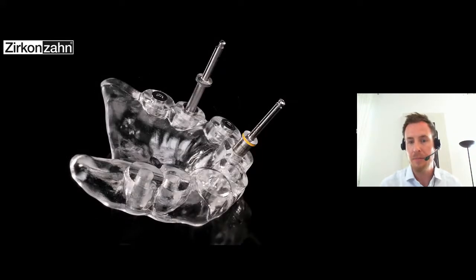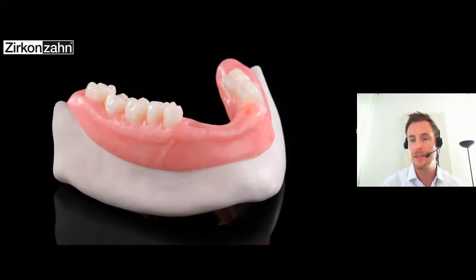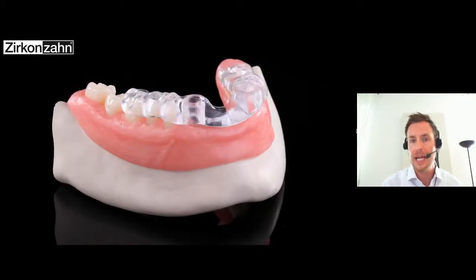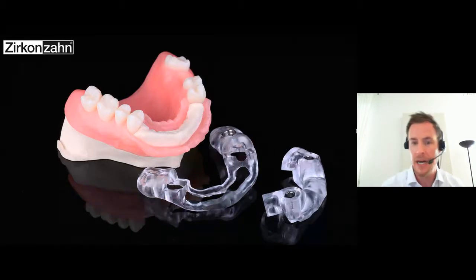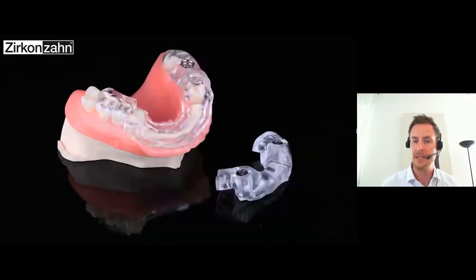So, and now we come to a special part we will implement in the future in our Implant Planner as well. Not just doing this kind of basic guide, we are able in the future to do a stackable guide, a two-component guide. That means the base guide, like on the left side you can see, is a positioning guide and a bone reduction guide at the same time. And if you place it onto the situation, the doctor has a guide to reduce the bone. If it's ready, he now places the other part onto it to drill the pilot holes into the bone.